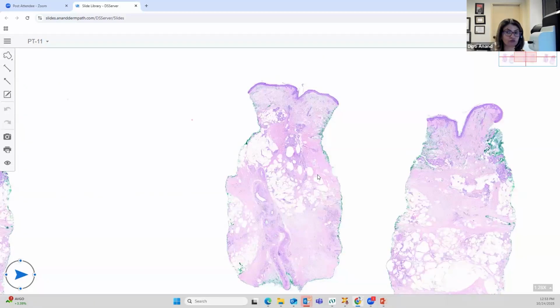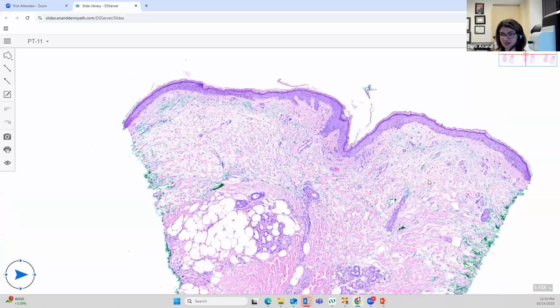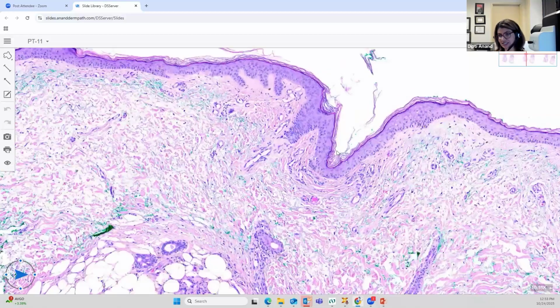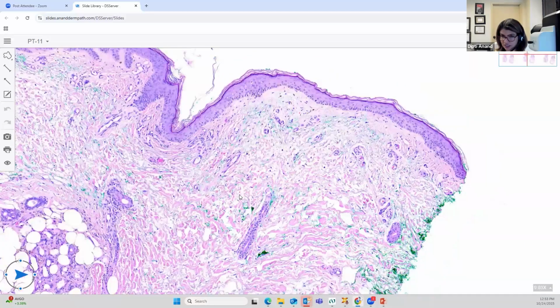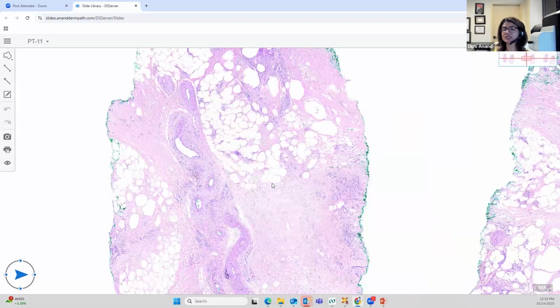Okay, so patients often have bad venous circulation in their legs. They have venous change, venous stasis, but the biopsy may not show stasis dermatitis. This is important. Not in all cases when you take a biopsy of lipodermatosclerosis will you see the stasis change in the dermis. So here you don't see any stasis change in the dermis. You may see it, but most often you do not see it. But the cause is a lobular panniculitis because of chronic venous stasis and ischemia.